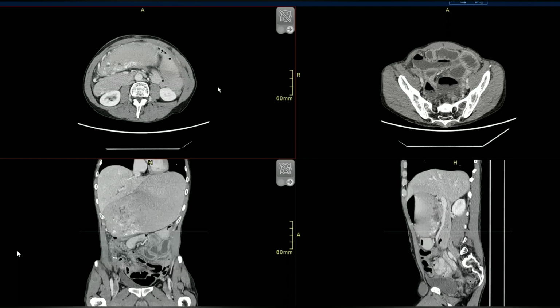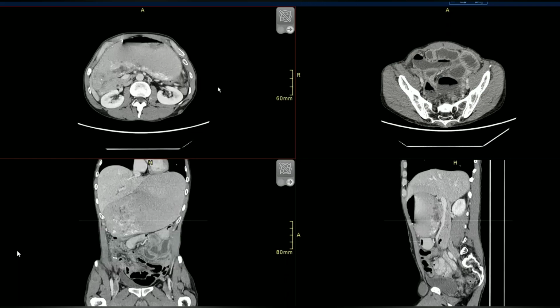Okay. So there are peripheral aspects of calcification, which I will confirm on the plain scan. As there's no plain scan, and there are no calcifications, okay, so there are dense foci noted in the stomach. The stomach is grossly distended. Kidneys are normal. Ma'am, can you scroll again?